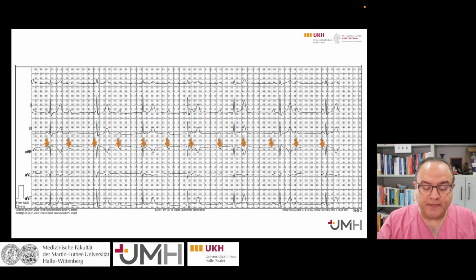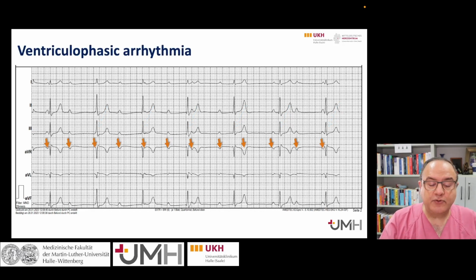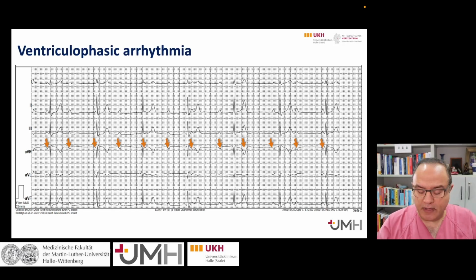One interesting phenomenon in his ECG is ventriculophasic arrhythmia. As you see, the PP intervals are not regular in this ECG. So what is the mechanism of ventriculophasic arrhythmia? We can explain it with two different mechanisms.